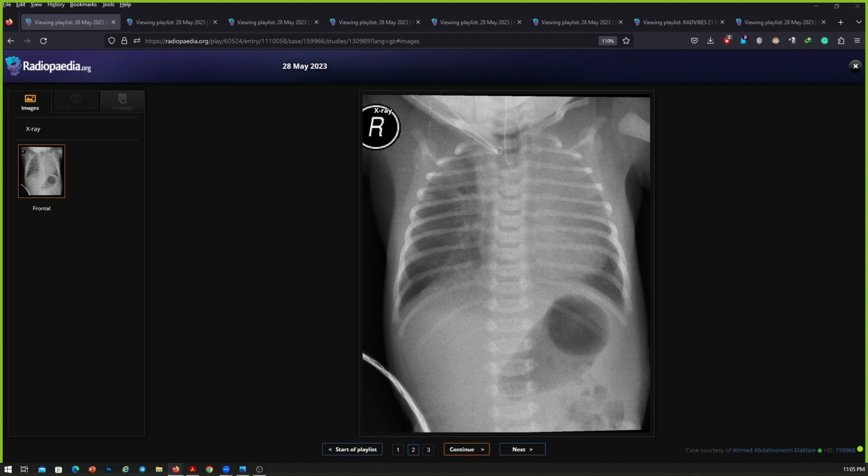And further on, I would be looking at the bones where I can see that there is a hemivertebra at, I guess, the level of C5. Sorry, T5. Could you please point it out first? Okay. So where is the hemivertebra that you were referring to? I think this part is part of a hemivertebra. Okay, anything else?